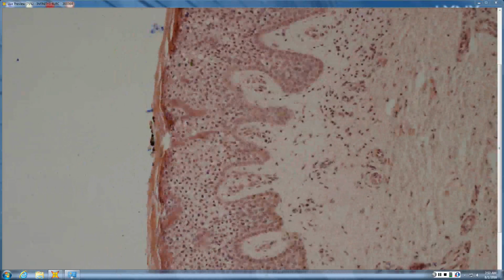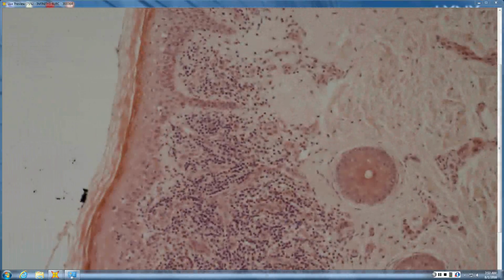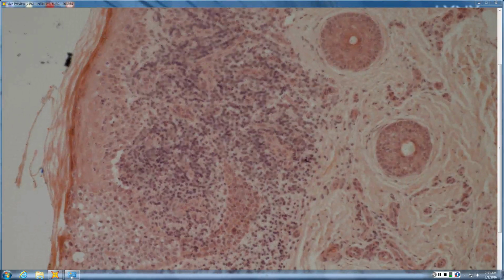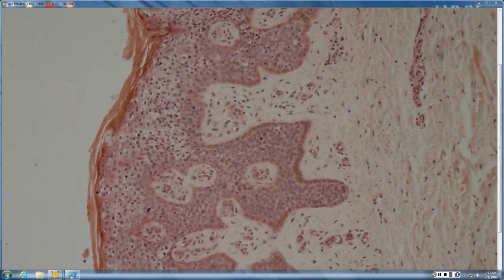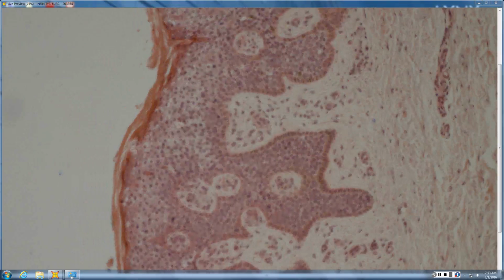It looked a little bit invasive over there. I favor right in there. So right in there, looks like you probably have some invasive carcinoma arising from it, but arising from what? Bowen's. So probably Bowen's.